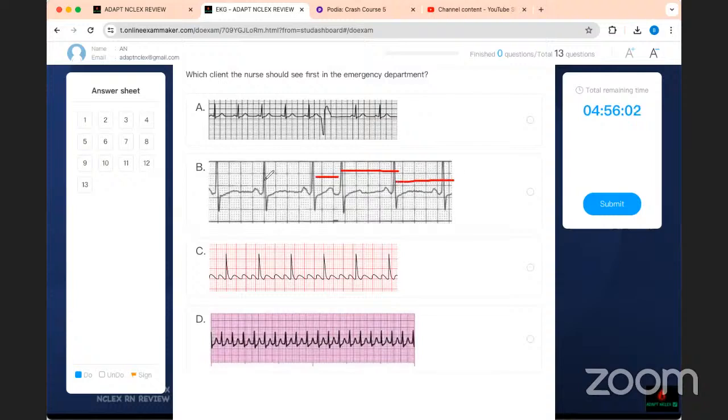The rhythm picks up and remains constant. There's only one associated with that. And you can see that is because the atrium contracted so fast before, over here, before everything started. So this is a PAC. So you have a premature atrial contraction, premature ventricular contraction.